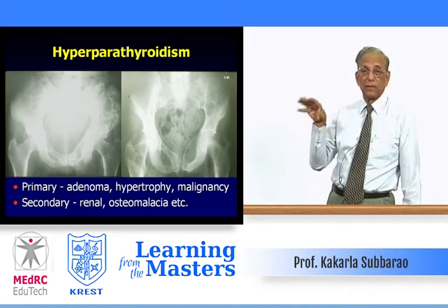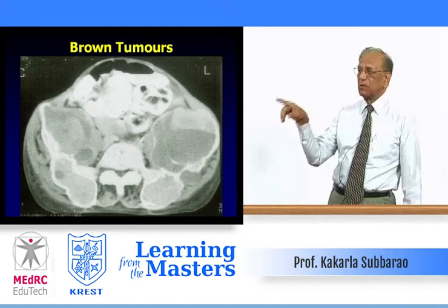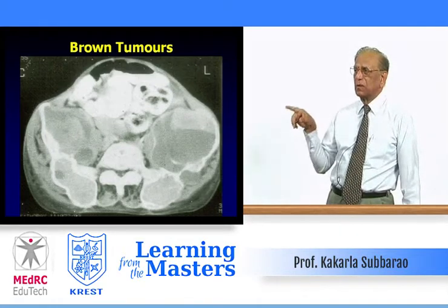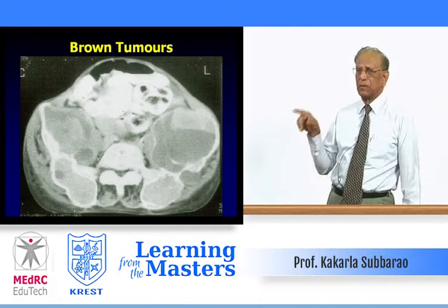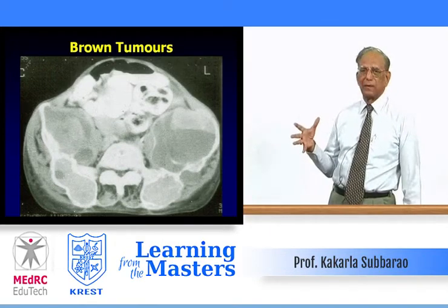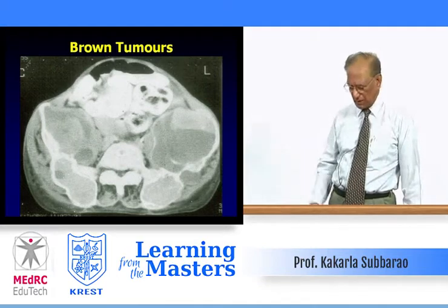Osteitis fibrosa cystica. Similarly, a brown tumor you could see on your right film, multiple brown tumors on the right involving the right iliac bone, pubic bone, acetabulum, right femoral neck, etc. Same CT, expansile, lytic lesions in both iliac bones involving the ischia, brown tumors and primary hyperparathyroidism.